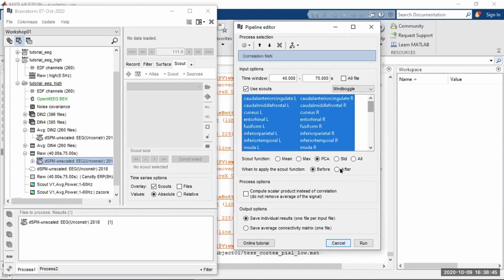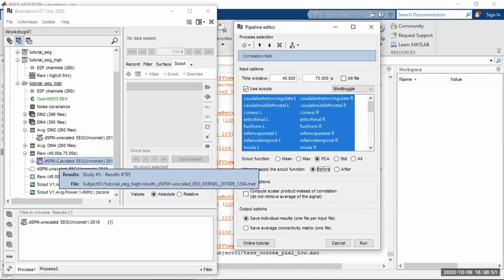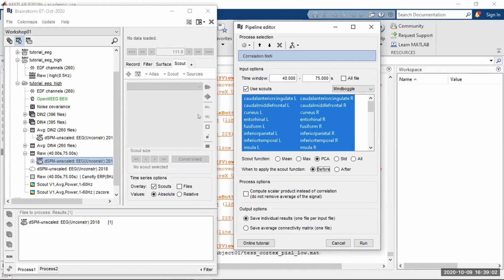This is why it's important to apply a scout function before, such that we don't run this on all of our 15,000 signals, because all different pairs of 15,000 signals starts being very intractable, and my poor little laptop will never finish computing and probably run out of memory.